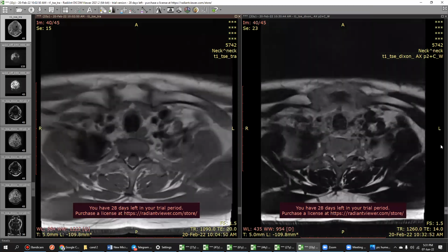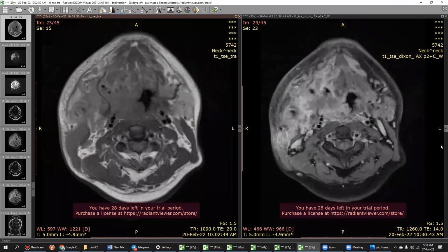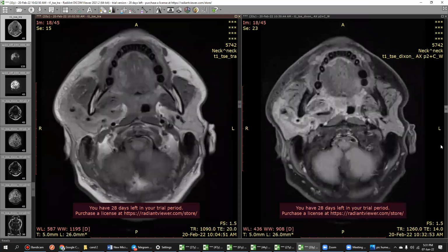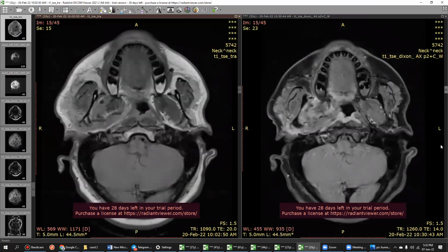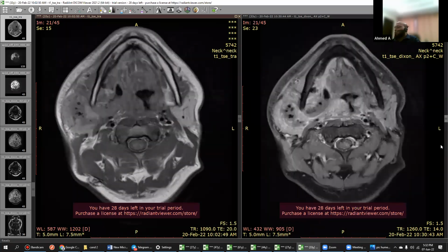I will look at the vascular structures because I'm suspecting Lemierre disease, because in these diffuse inflammations, the vessels could be thrombosed, specifically the venous vessels. Unfortunately, I do not have that, but that's a good idea.